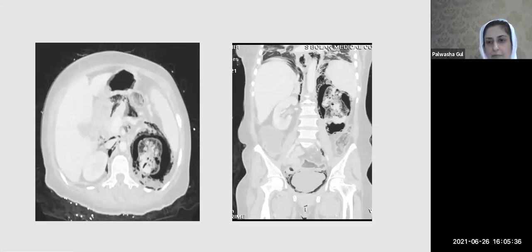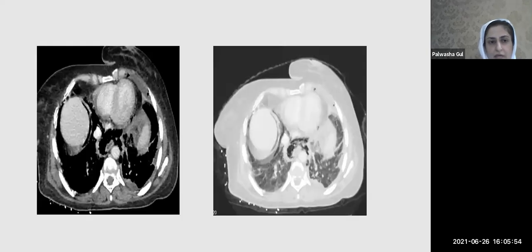So this was a simple case of emphysematous pyelonephritis, emphysematous cystitis, with some amount of air in the ureter as well. But I just wanted to show that it was so huge that it was going all the way here and there, and it was delineating the anatomy and the extension of the retroperitoneal space. Again, we can see free air along the hepatic margin and in the mediastinum.